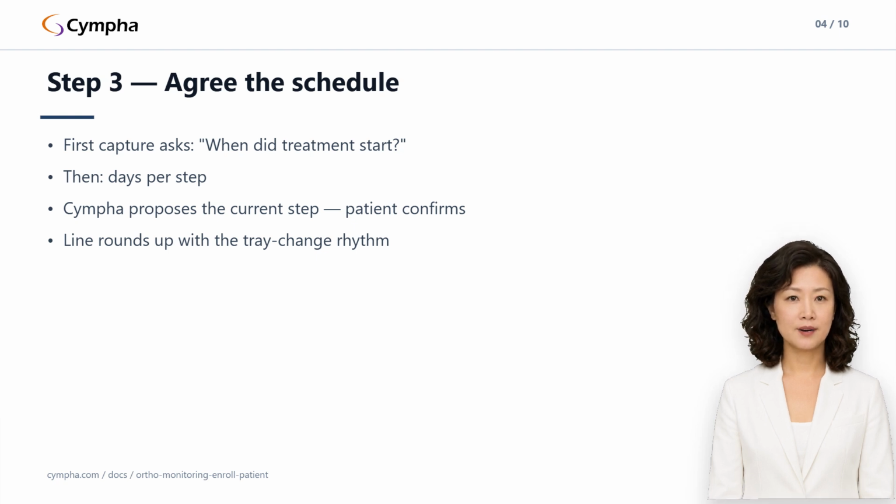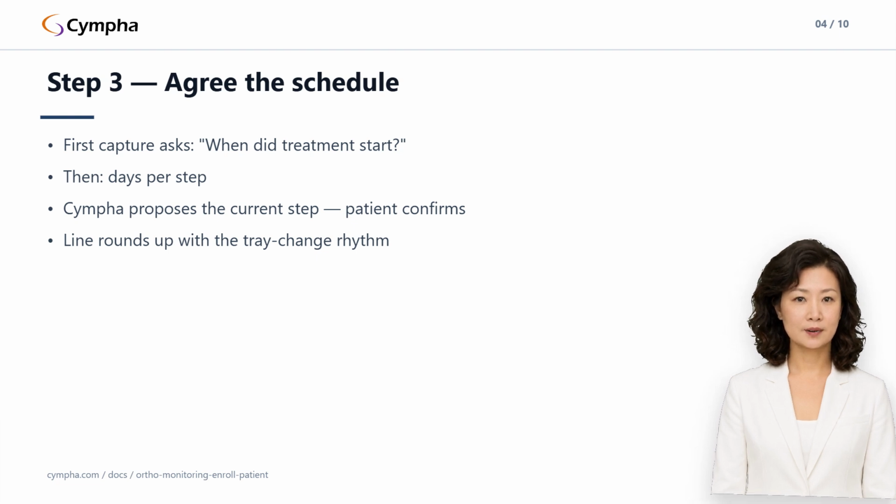Here's what the patient actually does so you can describe it chairside with confidence. They open the shared plan and start the camera flow. 5 orientations appear as tiles: front, left, right, upper, and lower. They pick one and 2 things happen.